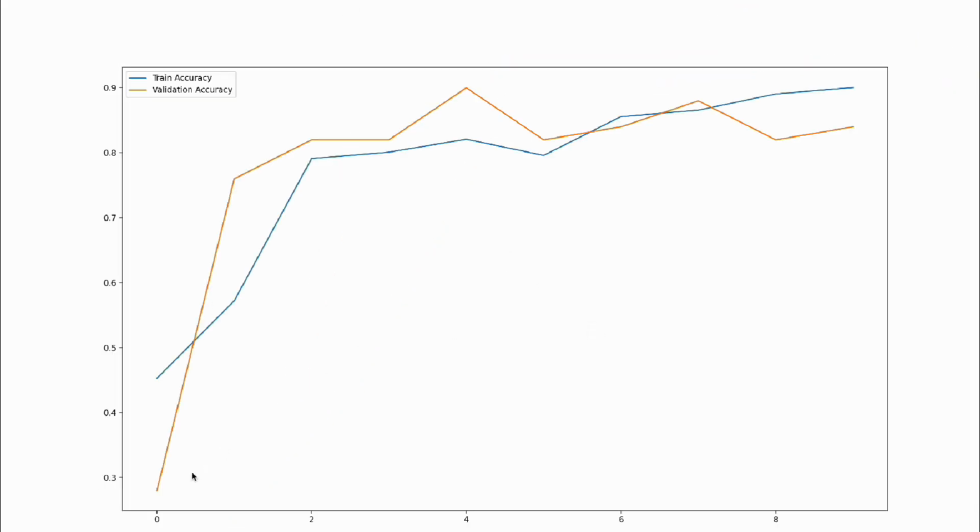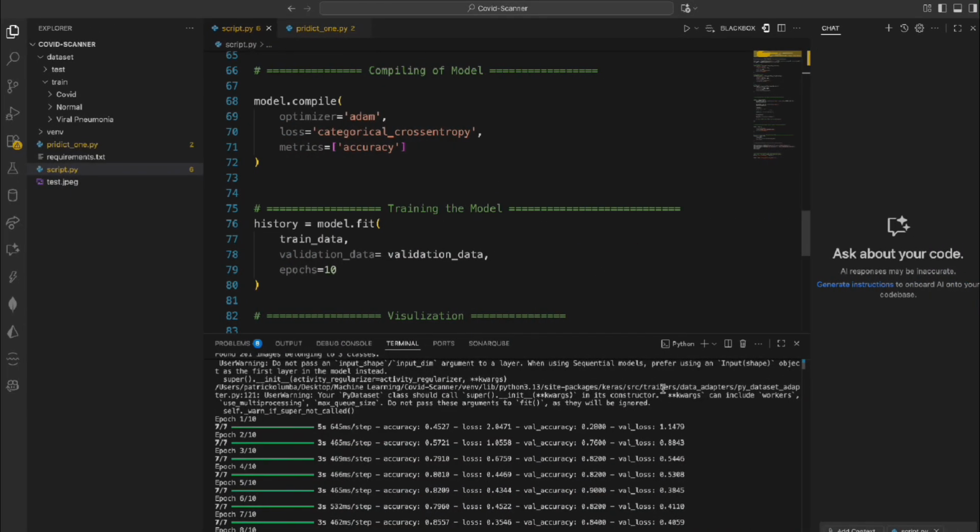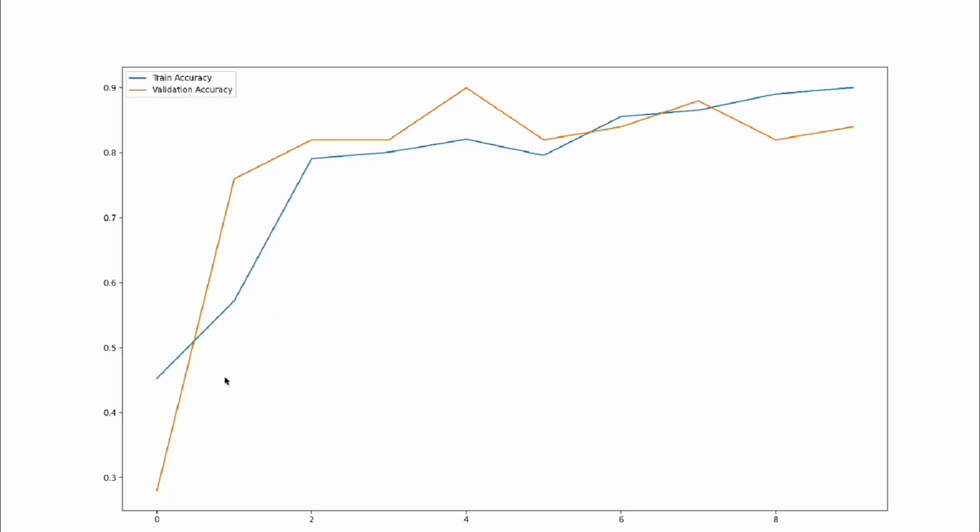We can see that a training accuracy over our validation accuracy. It's not overfitting basically, but let's go ahead and just see. They are not all up close together. Looks like a pretty good model, but yeah. We can do all the hyperparameters later, but I think this is absolutely fine. Let's go ahead and test and see how it's going to interpret that particular image that we're going to be testing it with. I'm talking about the single one.